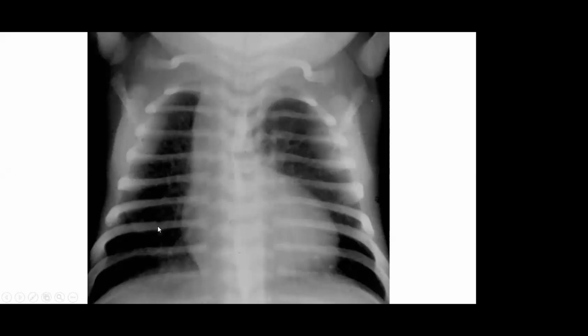Look, in a supine X-ray there will never be a basal pneumothorax. The air in a pneumothorax will always collect in the center and above. So you'll always see the air here on either side. You will never see the basal areas radiolucent. The air will never collect at the base, so you'll never see an X-ray like this. Even if the bases are radiolucent, you'll always see the air tracking above, and you will see the lung collapse like this, because the air will collect in the center and above.